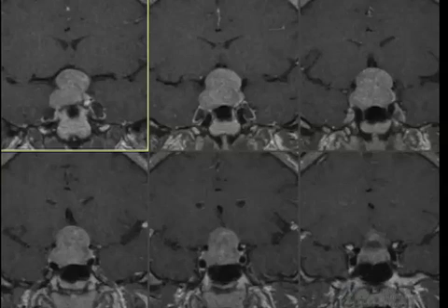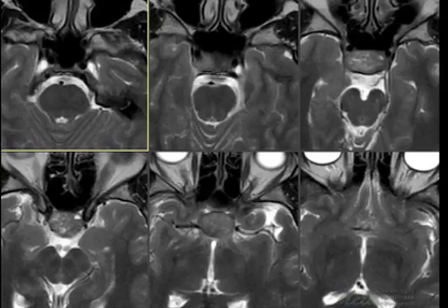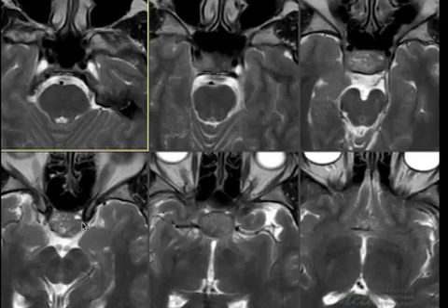And if you give contrast, it enhances homogeneously. And then we are talking about this possible hemorrhage creating rapid overgrowth. There is some heterogeneity, and there is some area of hypoenhancement that may be necrosis or some hypoperfused areas, but it doesn't have any definite area of hemorrhage. Then T2 is again very helpful to see the internal content, including hemorrhages. You can see the fluid level here. So this portion is suggesting there is some internal hemorrhage happening in the tumor.